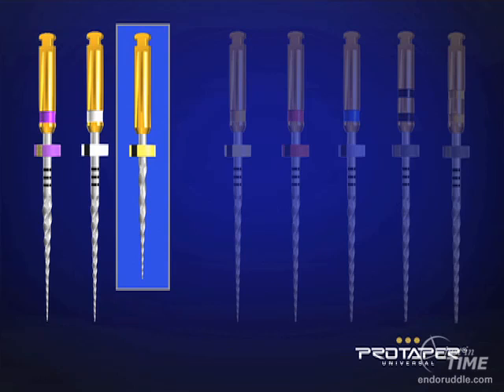Let me make a critical distinction. At D6, D7, D8, and D9 of Shaper X, you have a GG equivalent of a GG1, 2, 3, and 4. This means that D6, the cross-sectional diameter is equivalent to 5/10 of a millimeter. At D7, it's 7/10 of a millimeter, D8 is 9/10 of a millimeter, and D9 would be 1.1 millimeters. This means at D9, 1.1 millimeters, you have the same cross-sectional diameter as the purple and white are at D16, which are about 1.1 millimeters.